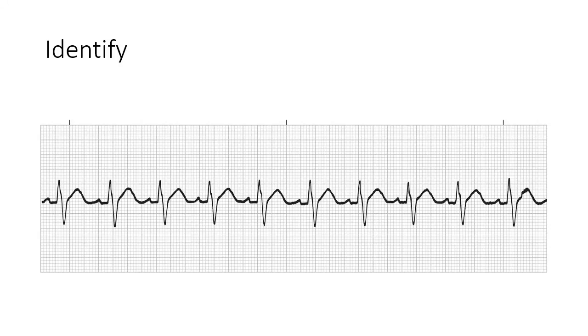Okay. I'm going to go with a normal sinus rhythm. Okay, good. That's exactly what it is.